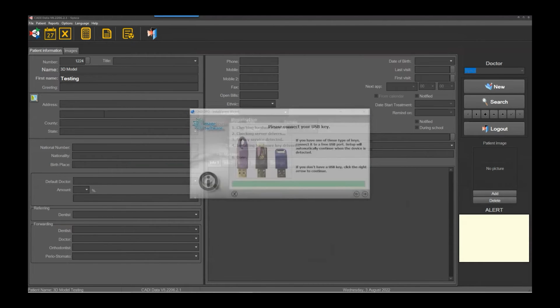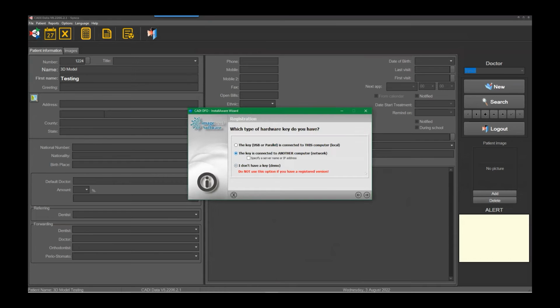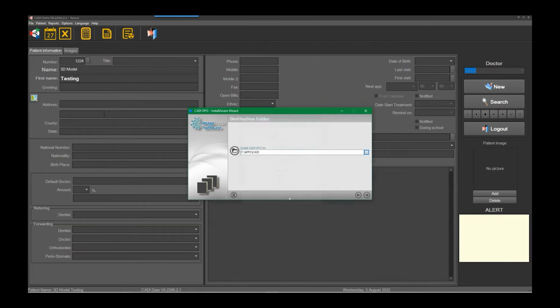What we're talking about right now is one of the biggest pain points in ortho: records are kind of everywhere, because we don't have a good way of organizing and getting them all together in one place. Say we had a patient in phase 1 ortho, and they've been out for 2 years, and now they're going to do phase 2. We're trying to pull their images, like their CT or their 3D.